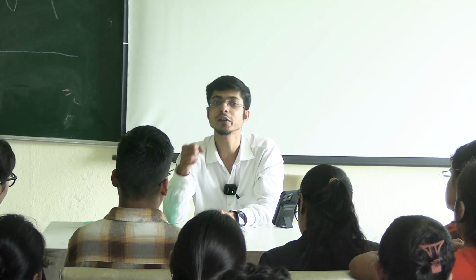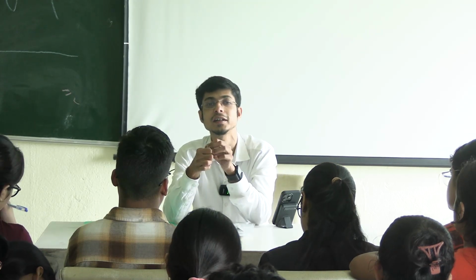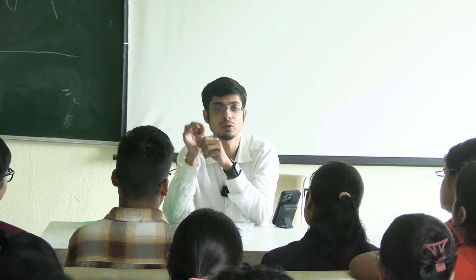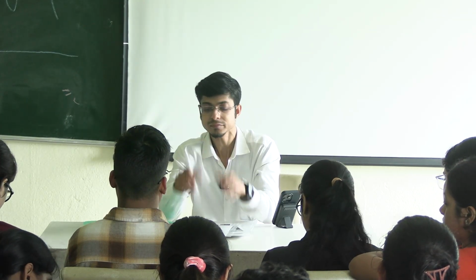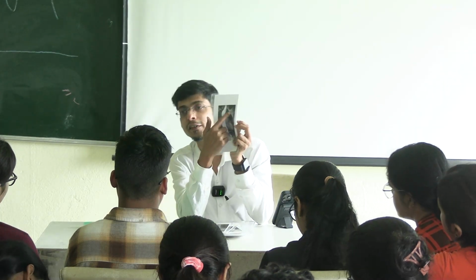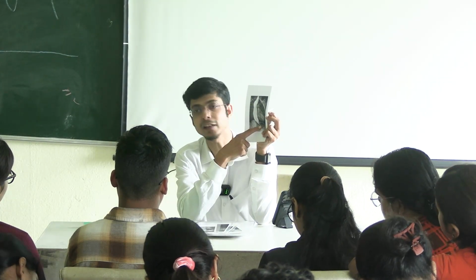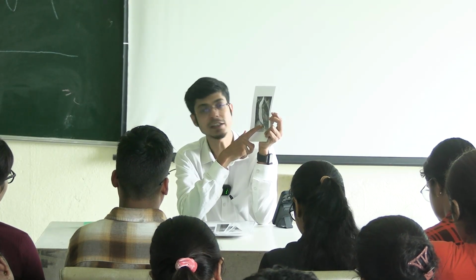But if the lower esophageal sphincter is unable to relax, what will happen? We can see a narrow opening of the esophageal sphincter. Just above it, we will see a bulged out or dilated part of the esophagus with the collection of the barium there. So the entire esophagus is dilated because the peristalsis is altered here. And then we see a narrow appearance.